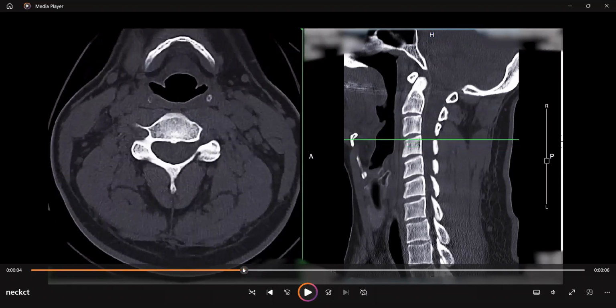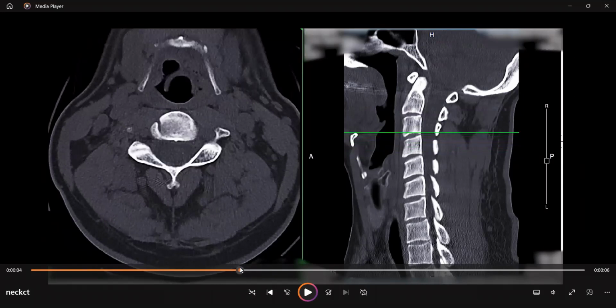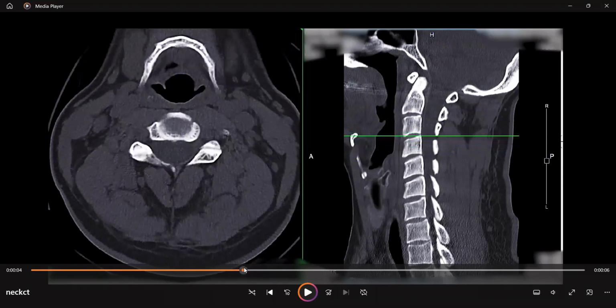So when I look at the top image here, I think of this almost like a cobra with the mouth open, right? And these are like the two fangs. Here you can see one eye. This cobra is winking at you. Here, the one eye is closed. Here, the right eye is open. And here are the fangs, like this.